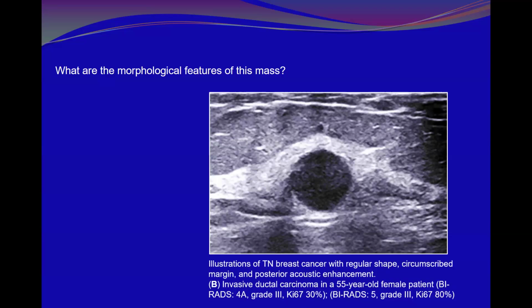Okay. This lesion in the literature is described as regular shape, circumscribed margin, posterior acoustic enhancement, maybe because of the round shape. They recommend biopsy.